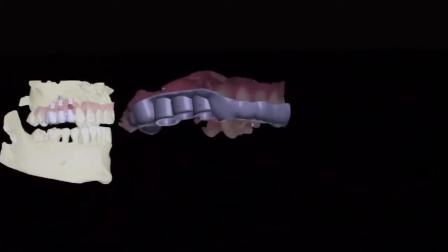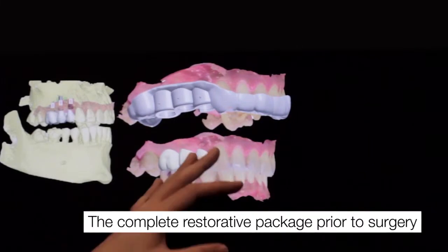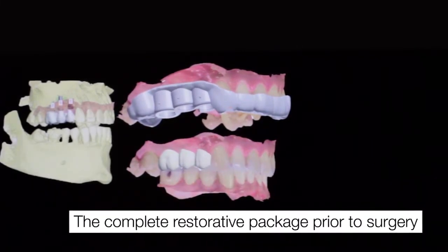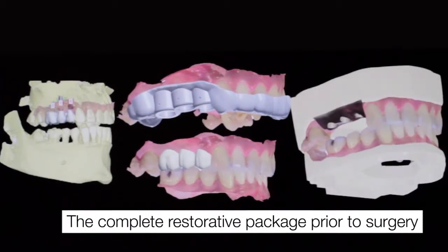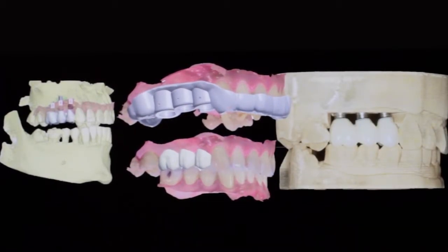So you see that Implant Studio gives us, prior to the surgery, very accurate planning, the implant guide that we're going to be producing and using for this patient. It's going to give us the final restorative design before the surgery, as well as even provide for us an implant level model that we can have in our hands, fully digitally manufactured prior to any treatment.